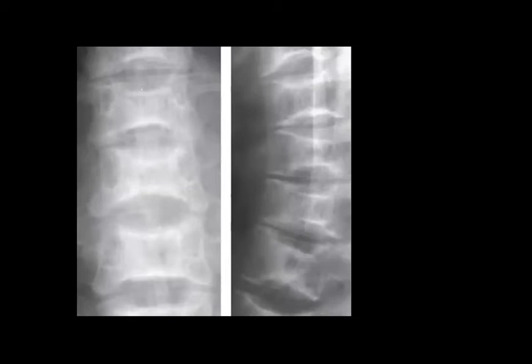H-shaped vertebrae, so nice. Nirmin, Marwa, our stars, big stars. So what do you think about this? I just want to show you the central depression, the H-shape. Yeah, sickle cell anemia, the most important, and we always mention that you will search for the other criteria of sickle cell disease. So we can just review what other criteria could be of sickle cell disease.